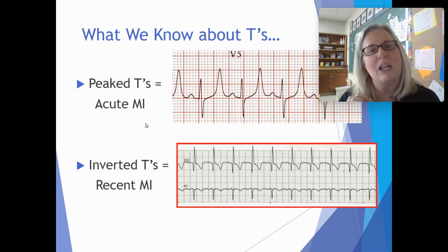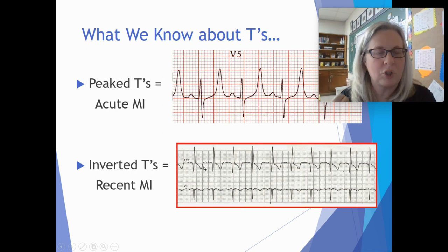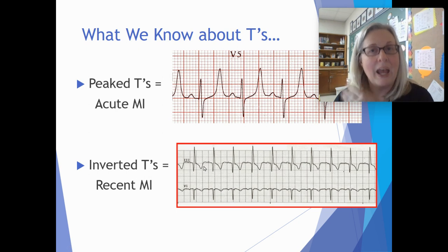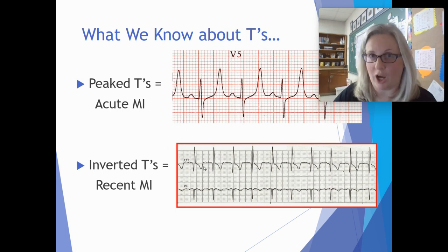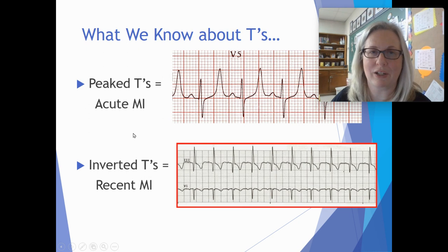I better go get checked out. I get them hooked up to the EKG machine and I see these deeply inverted T's. So inverted T's like this that are deep, the more deep they are, the more recent an MI. So this is telling me this guy had a heart attack when he was having that chest pain at home while he was shoveling. Didn't go to the hospital, didn't do any of that. This happens a lot, by the way. They come in, we hook them up, they've already had a heart attack.